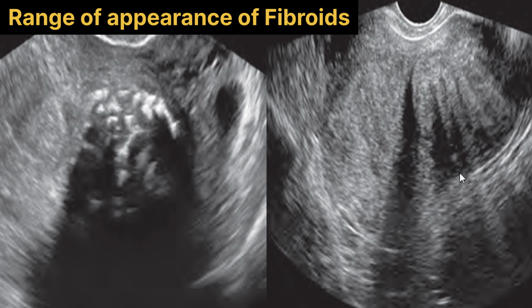Now, this is a transverse transvaginal image of the pelvis, and it shows fibroids with multiple well-defined recurring shadows alternating with echogenic linear areas, resembling Venetian blinds, and this is a common pattern of shadowing originating from fibroids. This fibroid is exophytic, arising from the lateral margin of the uterus. The endometrium of the uterus is visualized here.